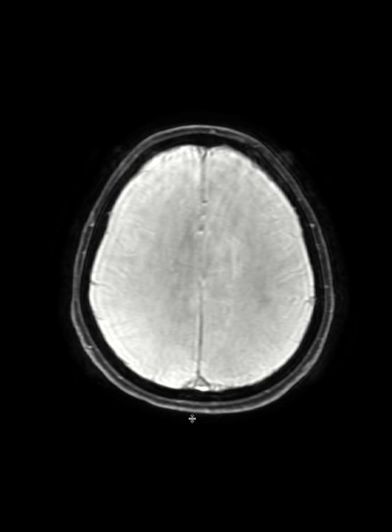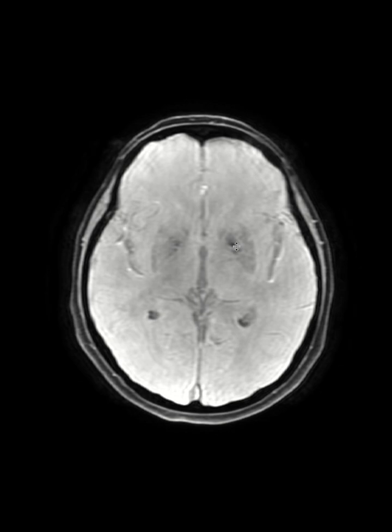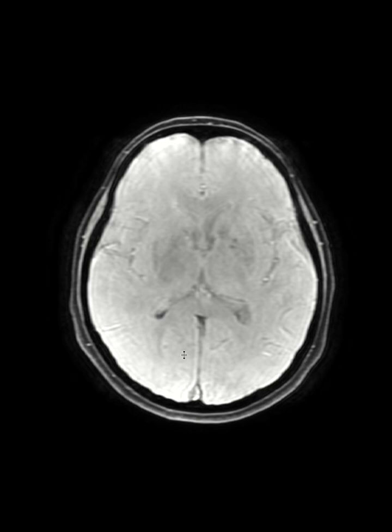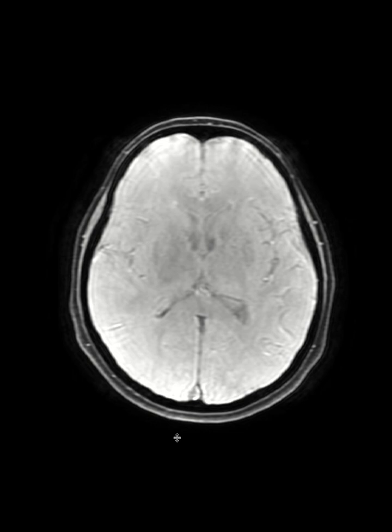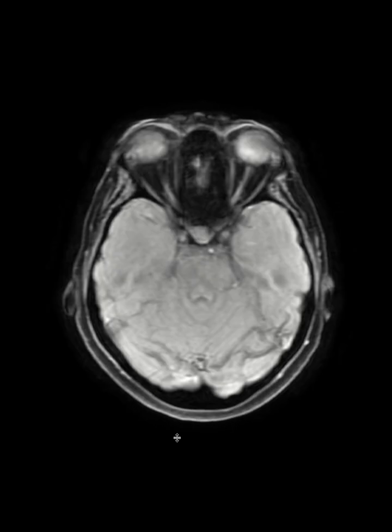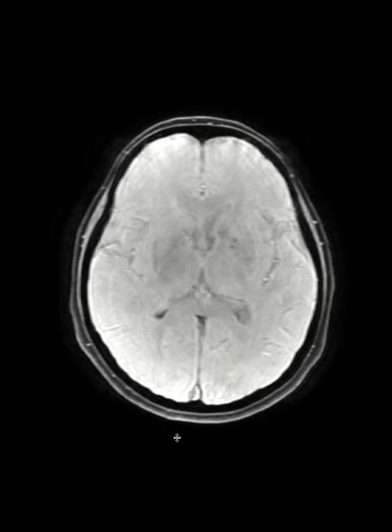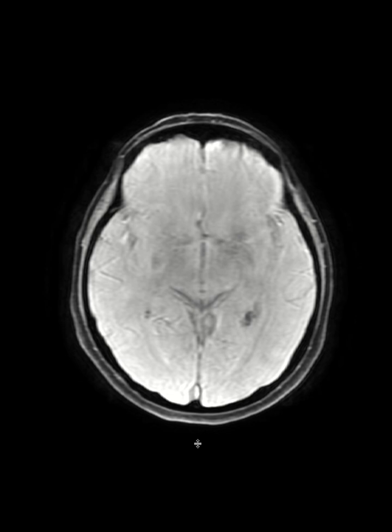Next one is some sort of susceptibility imaging that looks for hemorrhage or calcification. As you see here, these areas like globus pallidus mineralization or the choroid plexus are just blooming. So areas of calcification or hemorrhage are going to be blooming and dark on this susceptibility imaging. We have some other ways to differentiate between calcium and hemorrhage, that is going to be in another video, but just remember that anything that is calcium or hemorrhage is going to be blooming on this SWI, or susceptibility weighted imaging, which can have different types. It can be GRE, it can be SWAN, it can be SWI. I mean, there are different types of susceptibility imaging.